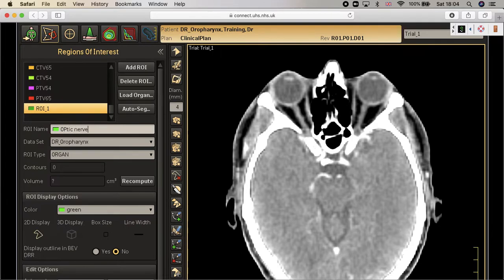It's not common to have a complete optic nerve like that. Sometimes it appears as a small piece, and then the second cut downward, and medially it will be here. So we all know that the optic nerve is directed medially and downward. I will draw it inside the canal, and we talked about it before.